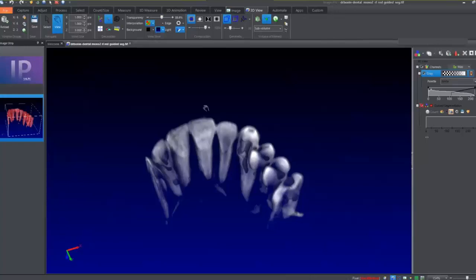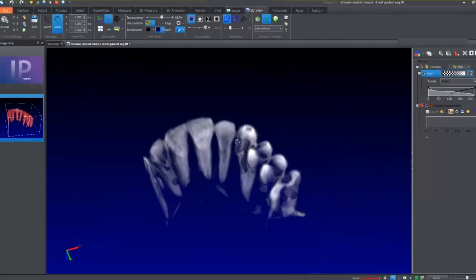So just as a quick review, when you bring your images in, look at the volume rendering specifications over here, and if you'd like, you can maximize those for resolution, or you can look at them somewhat decimated like this.